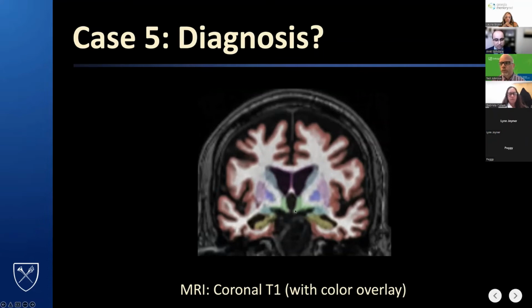We have sort of an internal reference that this is a normal looking set of lateral ventricles and third ventricle, but the temporal horns that should be really, really small and slit-like under normal conditions are way too big, and the hippocampi are far too small. In this case, looking at the entorhinal cortex, the parahippocampal gyrus, we're not seeing a ton of atrophy here, but those are some other signs that we're going to be looking for to help point us towards this diagnosis.